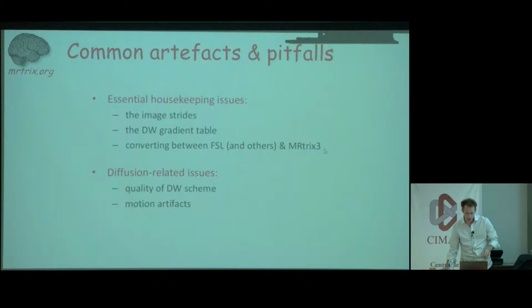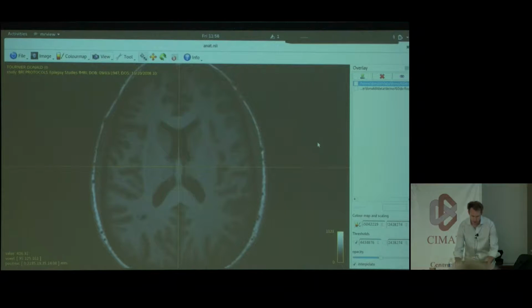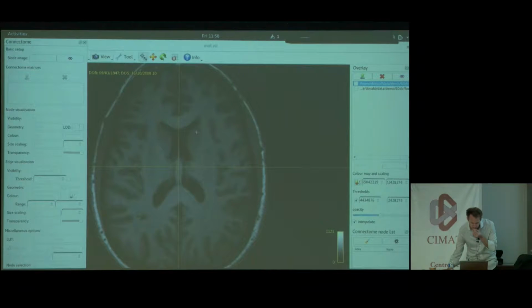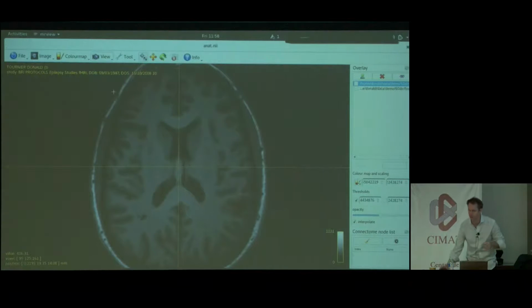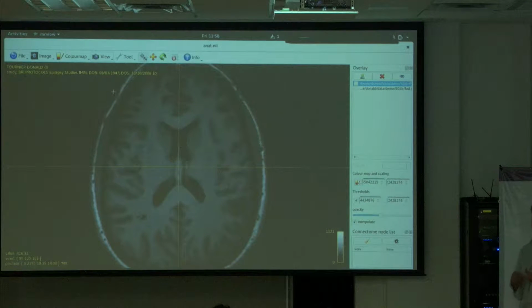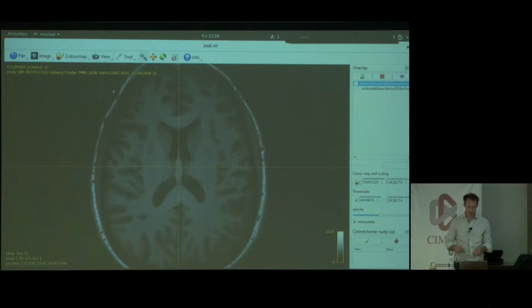So there we go. One last question about the viewer. Yep. Surfaces? Can you load surfaces? Now we can. Now you can. Hang on. This is very fresh stuff, so I haven't looked at it. But in the Connectome tool, you'd have to talk to Rob about this. But he's got facilities now to start looking at using surfaces, and there's a lot of movement in that area. So it's not mainstream yet, but it will be coming.